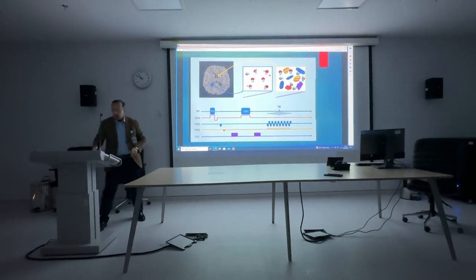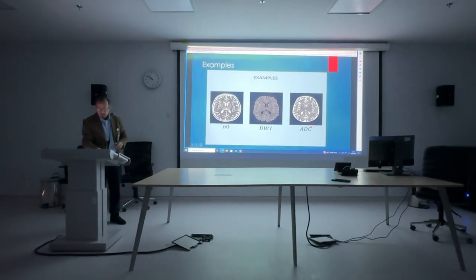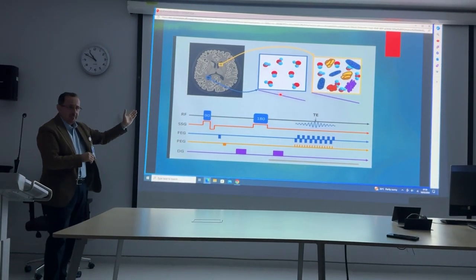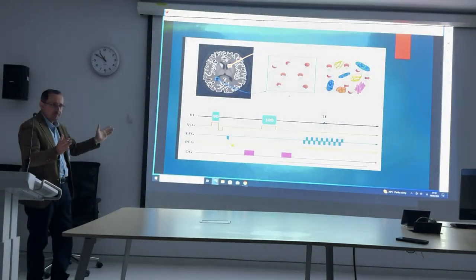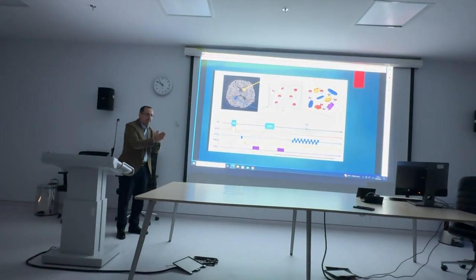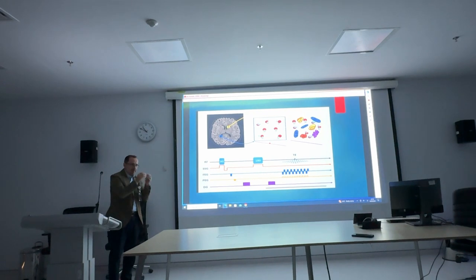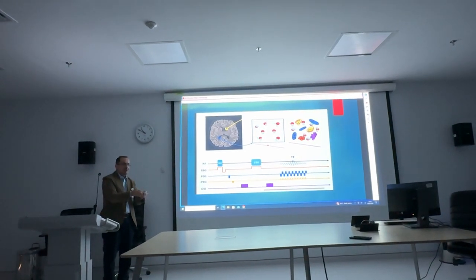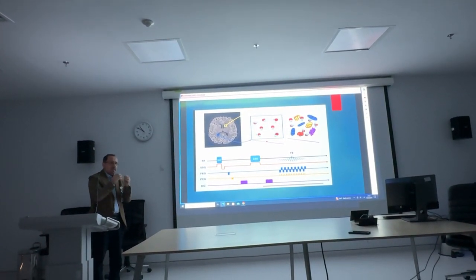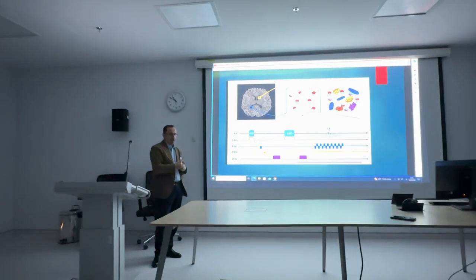This is the result. We talked previously, this is not enough. We have to combine the DW weighted images with the mother image. This is a computer function. We merge them together. We try to eliminate the T2 effect from the diffusion images and remove contamination of the T2 images by computer work from the DW images, and the result is the true evaluation and calculation of the diffusion, and we can apply this to the computer and get our ADC map.